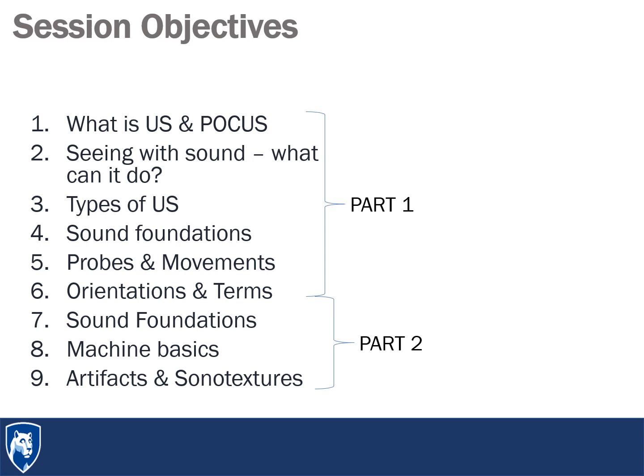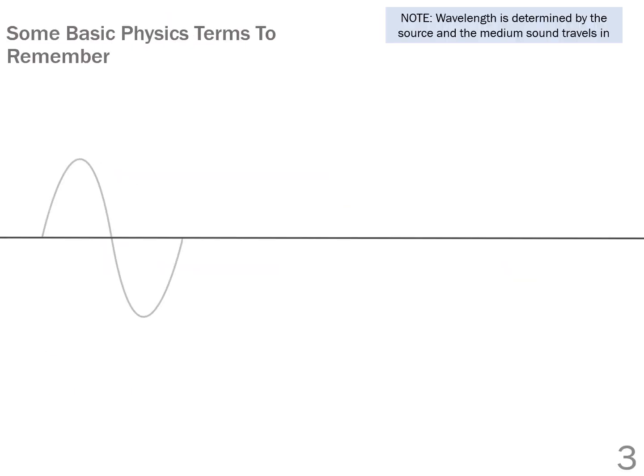Now we'll continue that with some sound foundations and going a little bit more into the artifacts and sonotextures on various images. Remember, we're trying to make you both sono-skilled and sono-savvy so that maybe you can't create every image, but you'll have a good comfort in interpreting a lot of the images as your skill set goes.